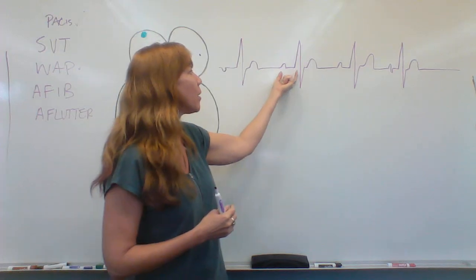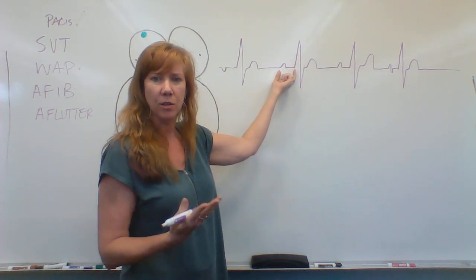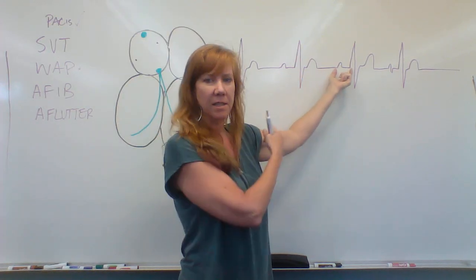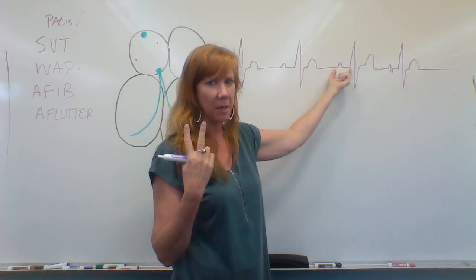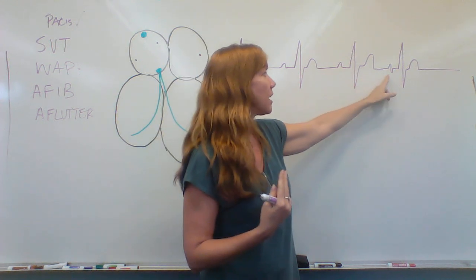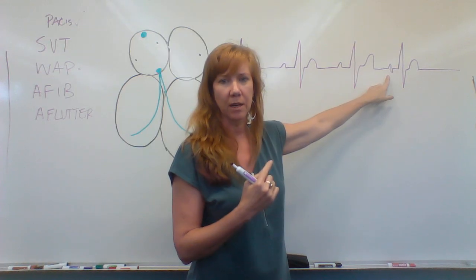And you're like, oh, but that P goes up. And this one is a normal measurement. And the next one is the same as the second P. So they have two different Ps with two different measurements. Oh, and look, now they have a third shaped P with a third measurement.